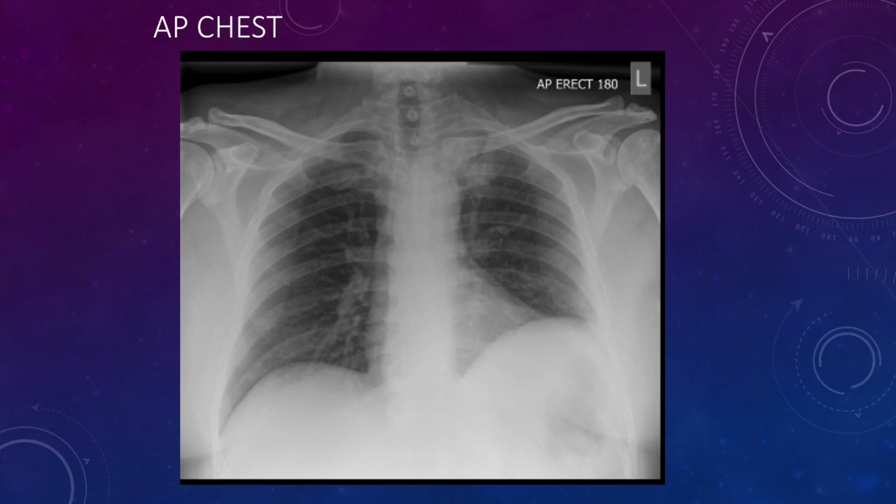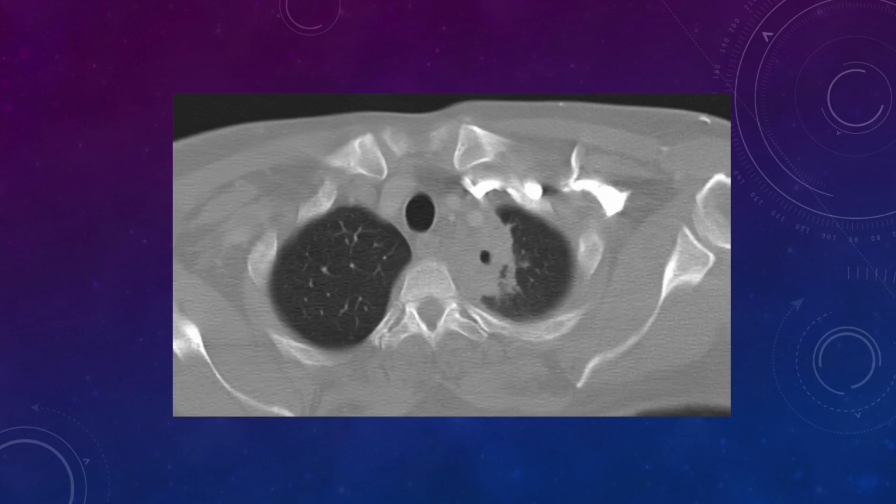Okay. The area that I'm getting you to think about is here. We have a normal right lung apex. Remember, the lung fields come about 1.5 centimetres above the clavicle. What do you think to the left lung apex? It's nowhere near as clear, is it? It's not aerated. We can't see lung clearly above there. And this is a nice tumour sat in the lung apex, hidden there in the top of the lung apex.